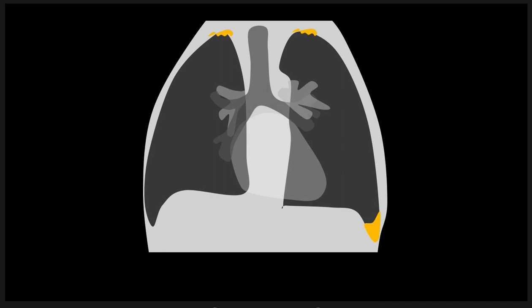Alright, so we discussed the apical portions. Now let's talk about this thing down here where we've got some scarring. This can occur from a whole bunch of different causes. Usually it's from a prior infection or some reason that blood got there, either a trauma or, well, I mean, trauma is going to be the only reason to get blood there, right? So prior trauma or prior infection are going to be number one and number two reasons to develop that scarring in this location.